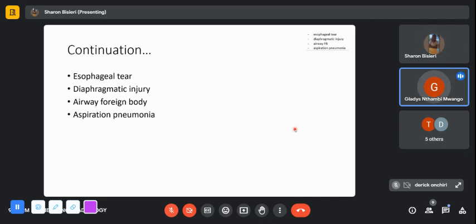As the radiologist reporting, we're the ones who ask for the lateral view, especially when you suspect a mediastinal lesion, to localize it better. But if you look for the signs that tell you it is anterior, middle, or posterior, you may be able to give a fairly adequate report with just one view.